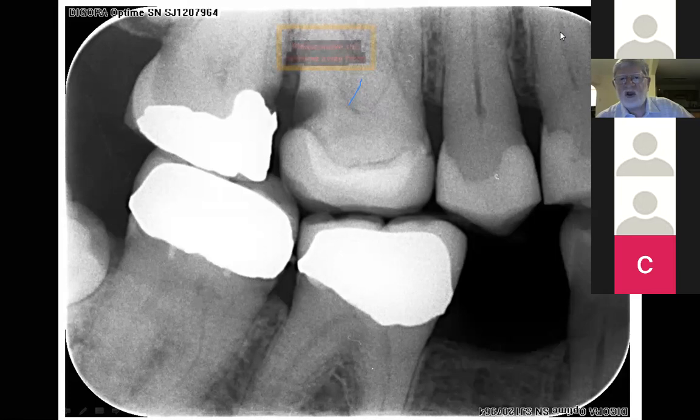The patient couldn't, whatever, keep that area clean. So he's got a lot of decay that's gone in below the filling on the 7. He's got this massive amount of decay that's gone in beneath the crown on the 6. I don't know yet if that is starting to interfere with the integrity of the core. It certainly looks like this on the radiograph. But so the first step here was to attack that decay.